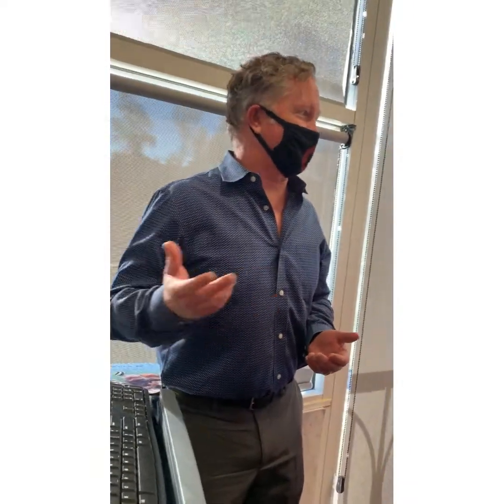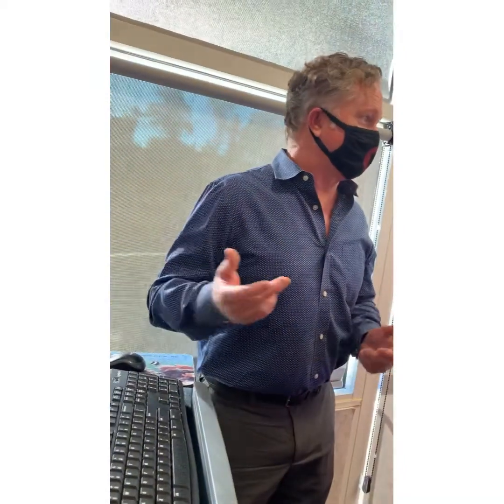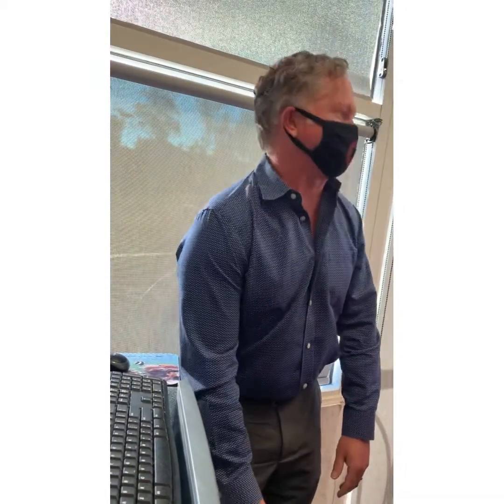10 minutes of watching it process is like watching grass grow or water boil or paint dry. It's just forever. There are some people now with 2 minutes. But the more you add your different filters, the more you process it, the longer it's gonna add some seconds on the processing time.